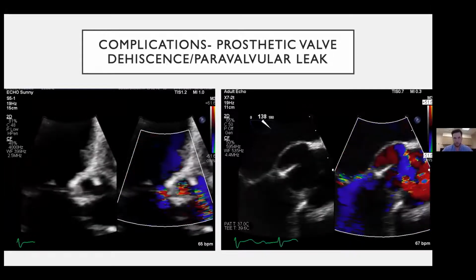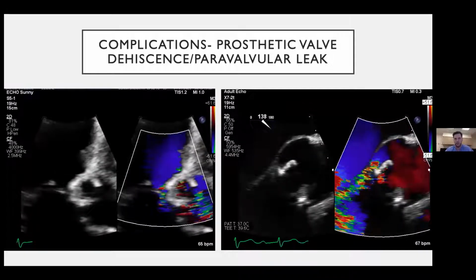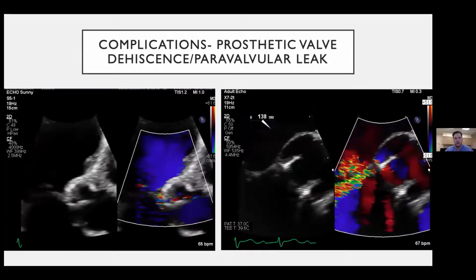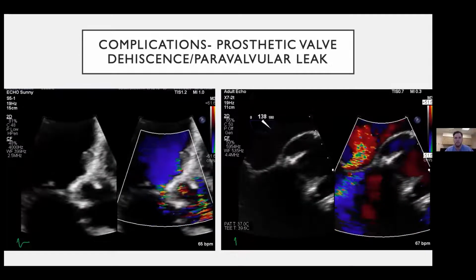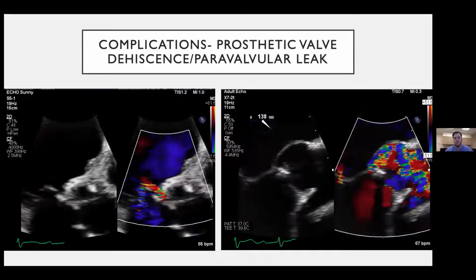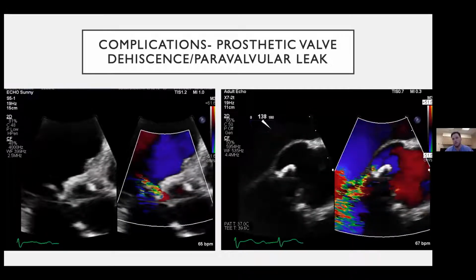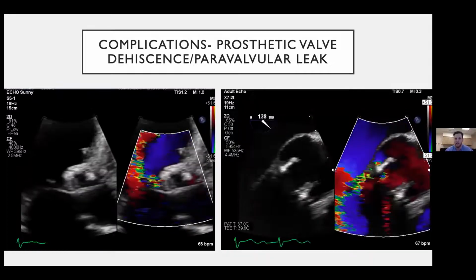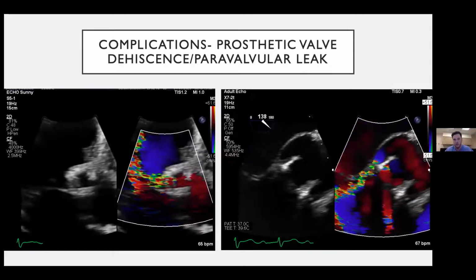So look for paravalvular regurgitation and valve instability or rocky motion of the prosthesis, and keep in mind that it doesn't necessarily imply active infection. Valve dehiscence can happen for other reasons, and it's also possible that you can have medically treated or healed endocarditis that can weaken the annulus and lead to late dehiscence.